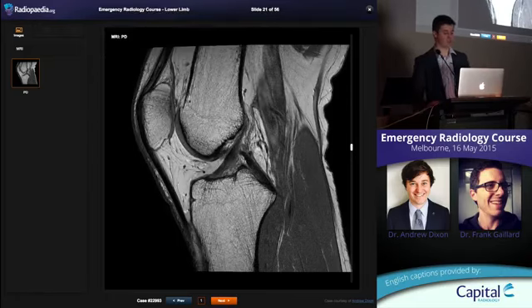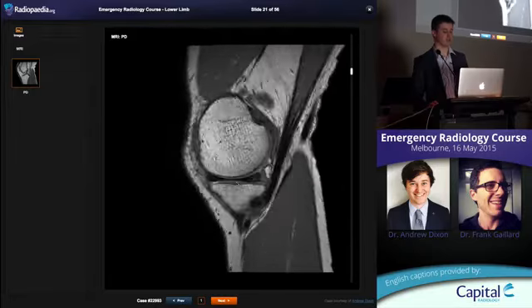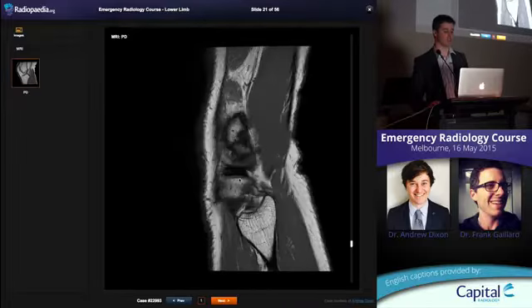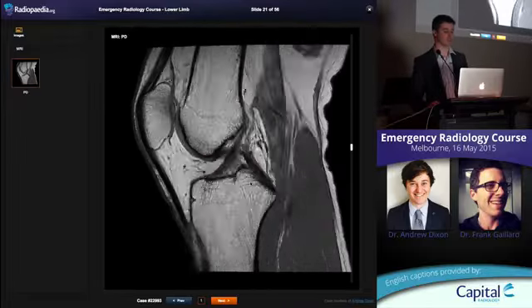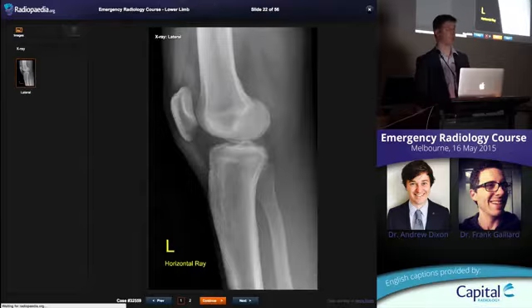Okay. Don't think we'll do any of the other anatomy. ACL here, PCL, menisci. Obviously MRI, very, very good for assessing those internal structures of the knee. Okay, but from an emergency radiology point of view, it's probably better to recognise some of the plain film findings and to know when to refer for an MRI. Or come back to an MRI knee course that I might teach in the future.